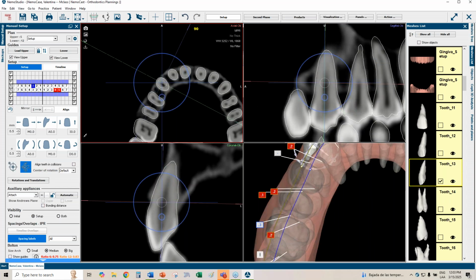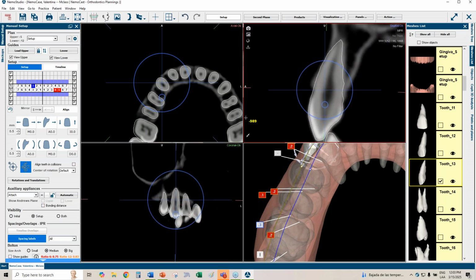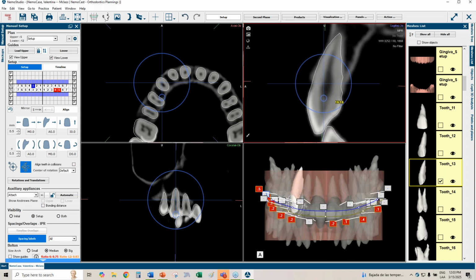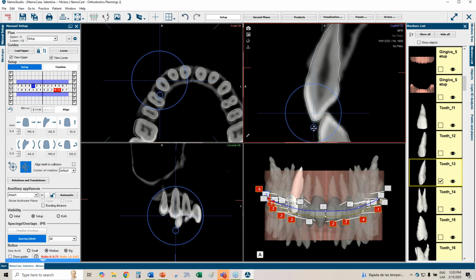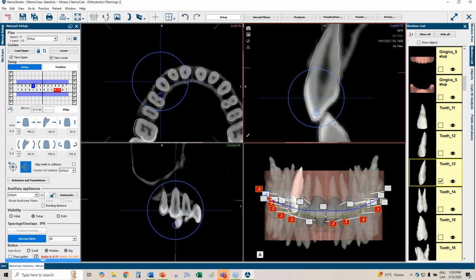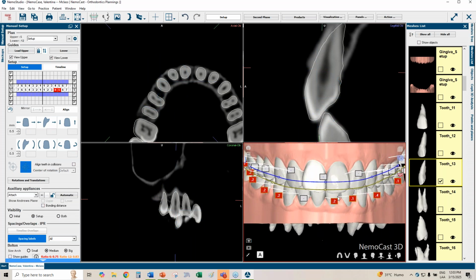Let's go with the canine right here. Okay, I can actually start managing it the different way, like that. Okay, I can visualize it right here. Okay, I have good canine overjet. I have a little bit of tipping, so I could try and give it a little bit more occlusal room in order to fit correctly into the patient. You can see it's already starting to take shape.